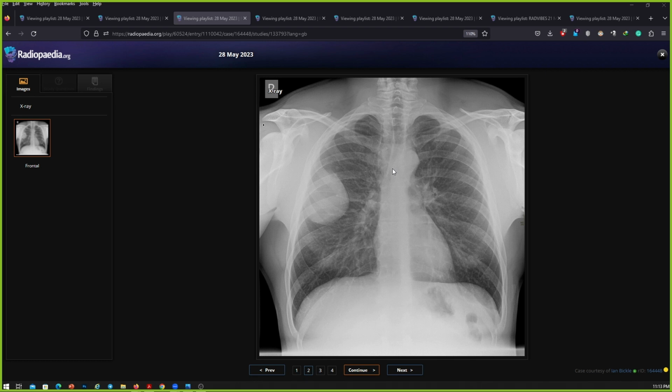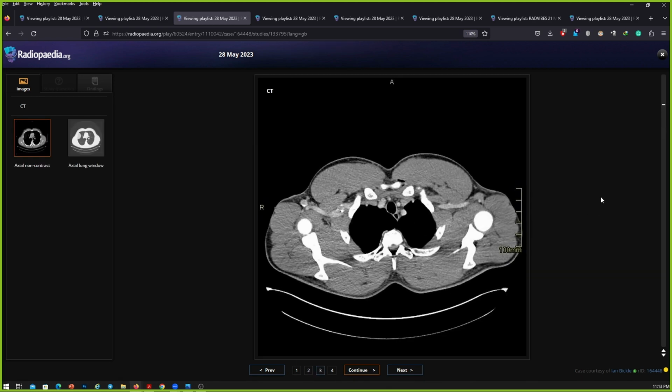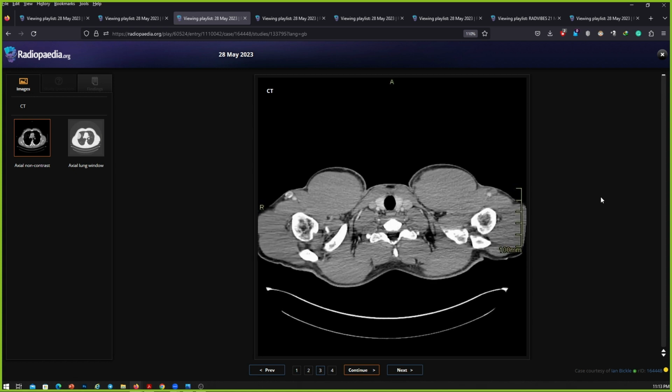In this patient, first of all, I would like to correlate with the patient's occupational history, and other than that, I would also like to see the CT scan if available. What scan would you like to see? If there is a post-contrast CT scan of the chest. If you want the CT scan, this is the CT scan that you wanted, and this is a non-contrast scan. Yeah, you can scroll and have a look at this case.